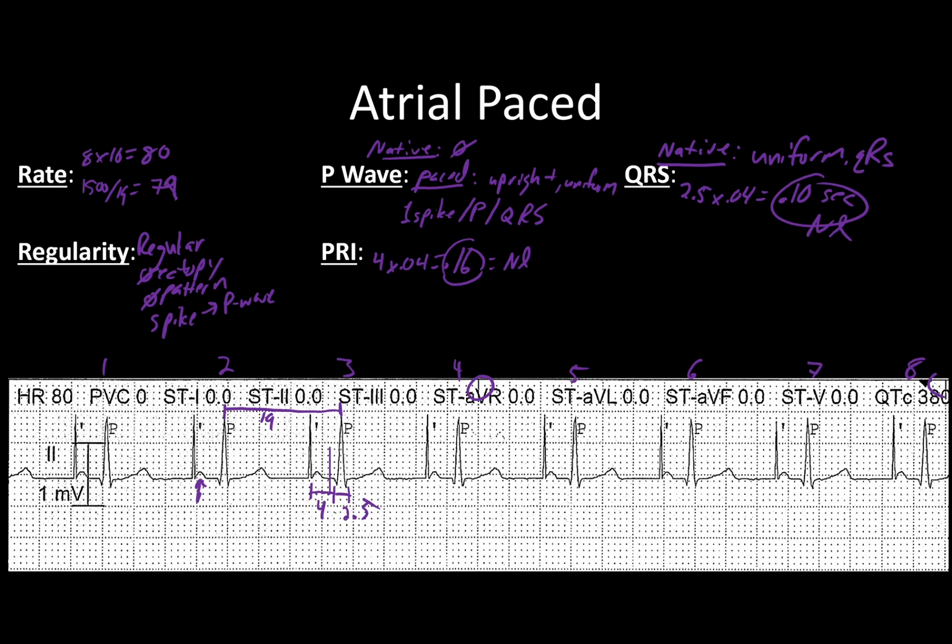So ultimately, what am I going to call this? Well, atrial paced with 100% capture. Or you could say 100% atrial paced. Or you can say 1-to-1 atrial pacing, whichever you're more comfortable with.